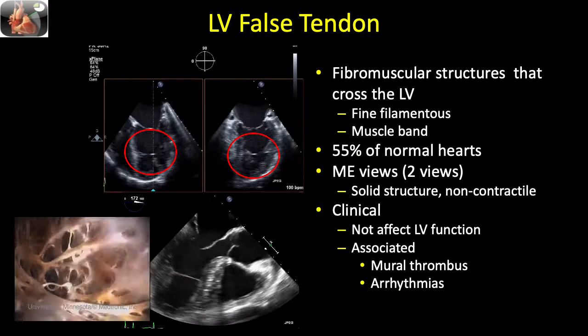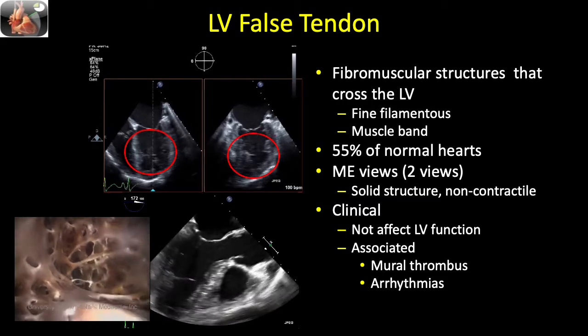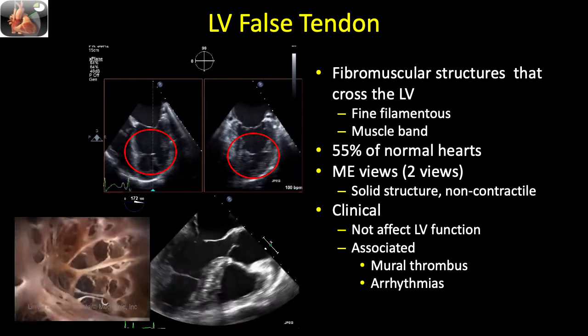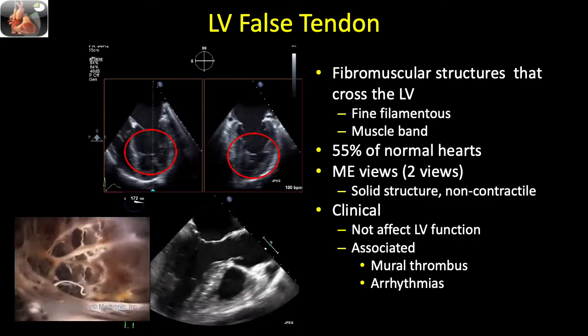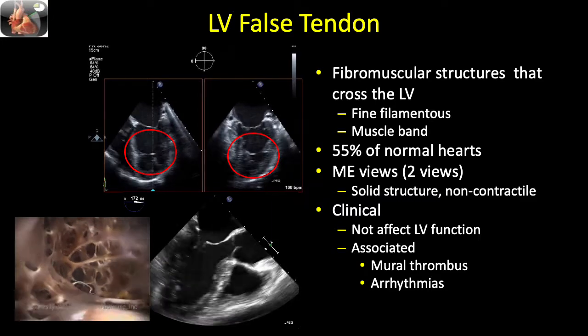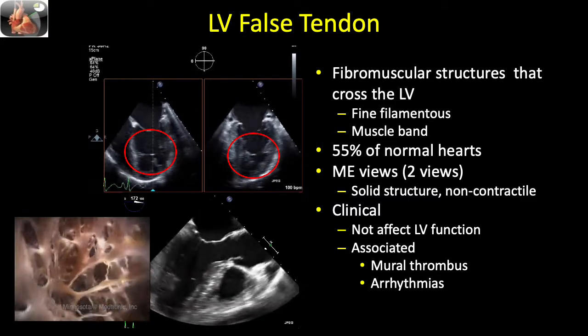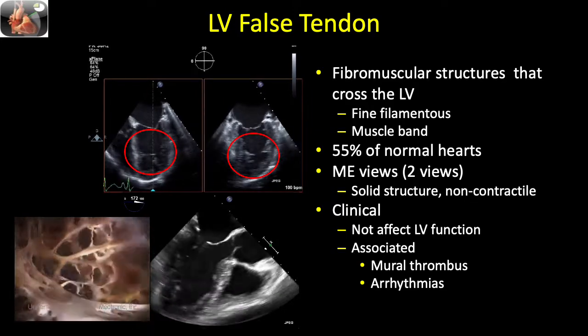Left ventricular bands appear as string-like thin bands in the left ventricular cavity in the midesophageal views, which may be transverse, longitudinal, or sagittal, and single or multiple. The location, direction, length, and thickness of LV bands vary depending on their embryonic origin.